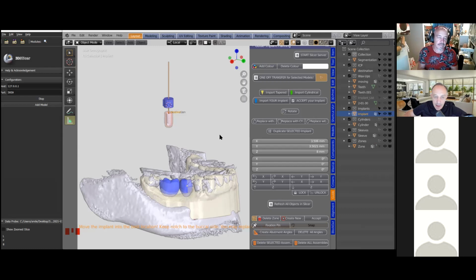In the back of the implant name or code name or product name, whatever you want to call it, you have to put certain suffix names like analog sleeve or just sleeve or scan body, and our coding will pick up those names like analog sleeve or implant and things like that. So just by adding suffixes on the back, it should be functional.